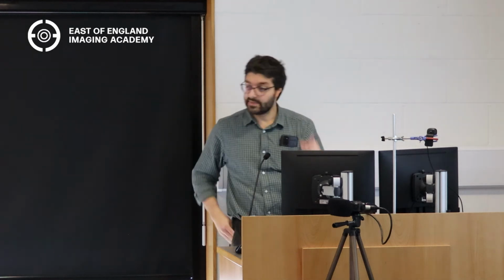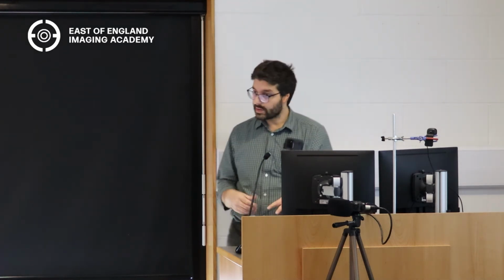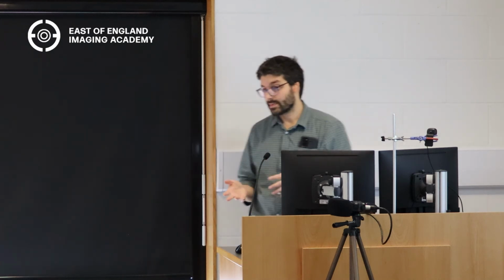In a patient of this age, you might be thinking of some sort of germ cell tumor. More common in the retroperitoneum, more common in men. Again, it's all about putting it together with the demographics. So it's not quite the right place and not quite the right demographics, but that's a good suggestion. Any other thoughts?